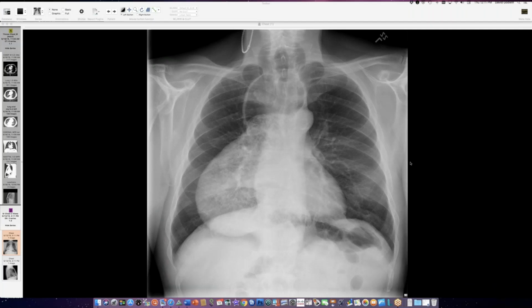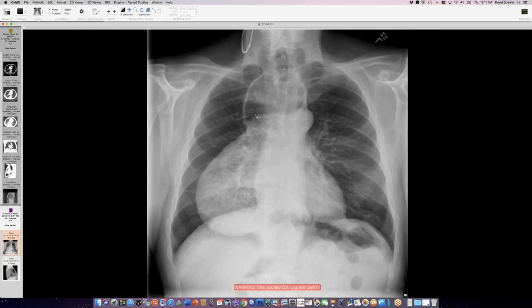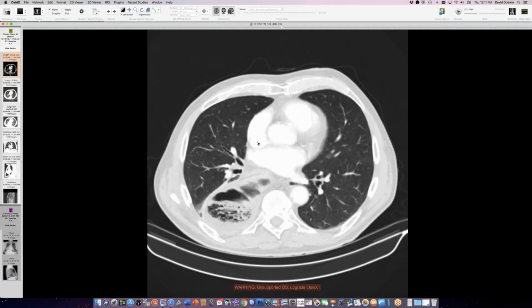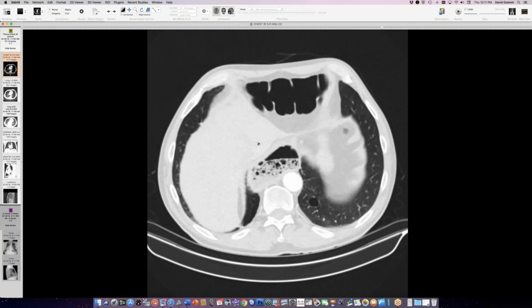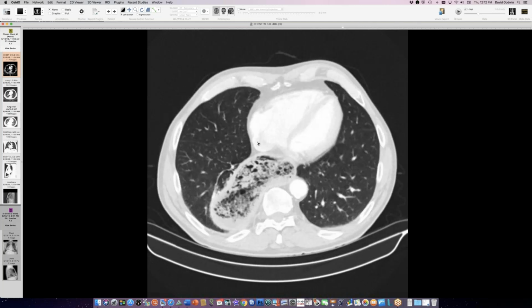So can people see an abnormal chest radiograph? Very abnormal. Yeah. So Chuck Roman shared this case of a very dilated esophagus full of a lot of debris with a nice air debris level here. And this is a case of horrible achalasia with lots of stuff in this very dilated esophagus, which tapers down. And there's no mass at the bottom here, so this is not a case of obstruction by carcinoma.